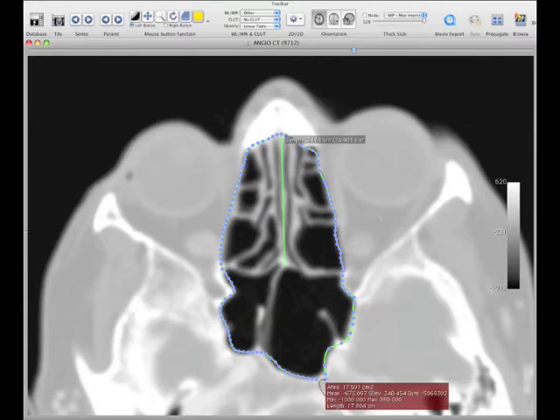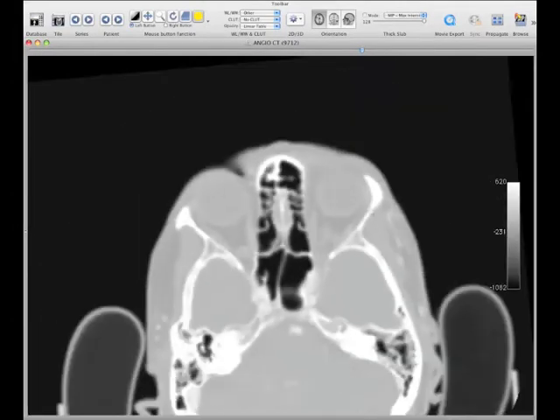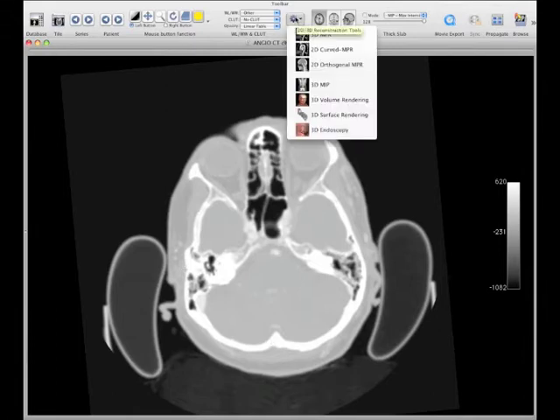So you can use this in your illustration work to come up with lengths and proportions. Okay, so even without making a 3D reconstruction, we can use Osirix to do some really interesting things. The distance between the ears, for instance, or the length of the skull versus the width of the skull.